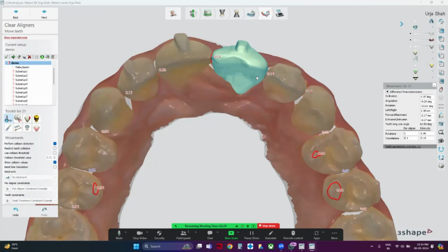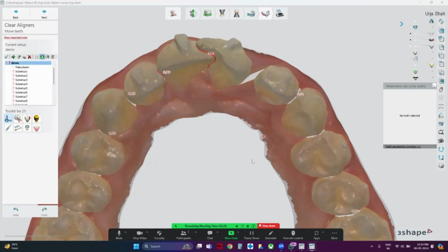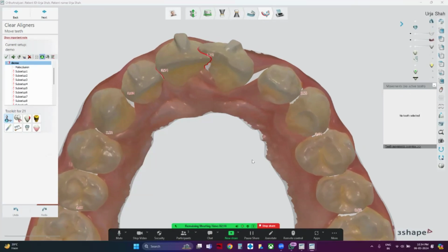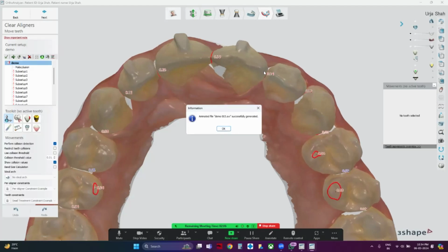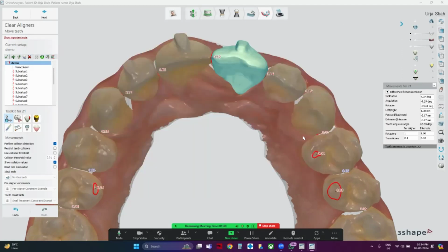So it's going to distally move first and then rotate. Oops. Didn't work in my favor. So basically it's not moving distally as much as it is moving towards this part of the tooth. So it doesn't work for me. So there is no point that I make it like this, and it should continue at the existing stage. But did you get an idea?